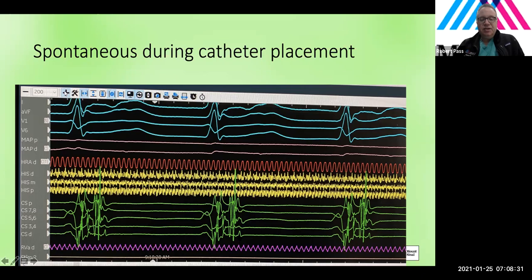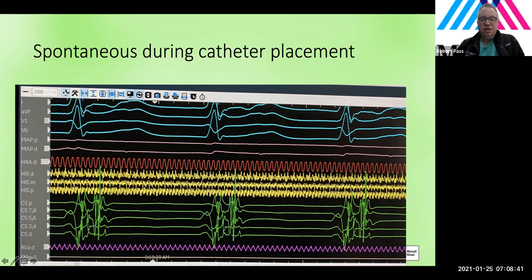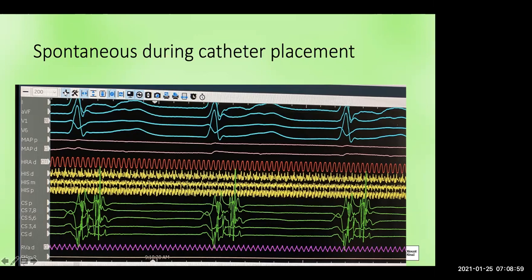So I think in the distal CS, as you said, I think this CS pair, this A is kind of late. Oh, that's the, okay. Got it. But I think if you look here in 5-6, you could argue that this onset is pretty early, or at least is earlier. Let's put it this way. It's earlier than the proximal coronary sinus. Mm-hmm. It's also earlier than the distal coronary sinus. So it's somewhere in the area of 5-6 or 7-8, right? Mm-hmm. They're sort of similar in time.